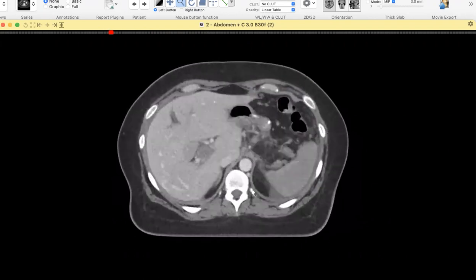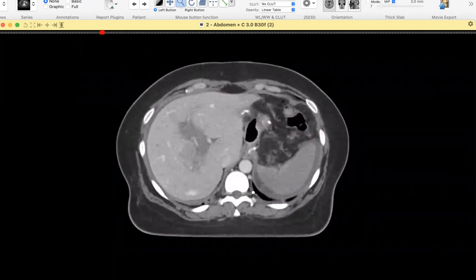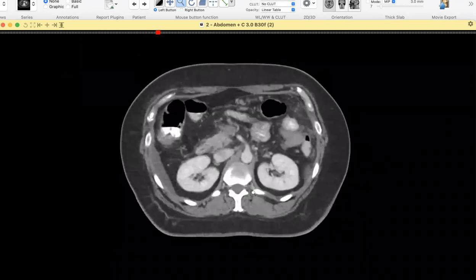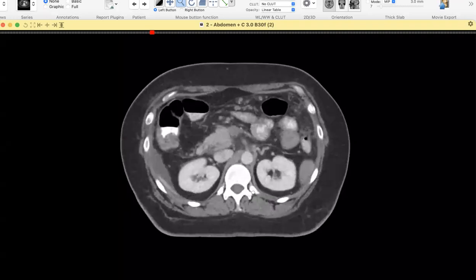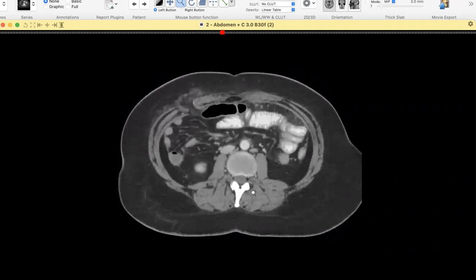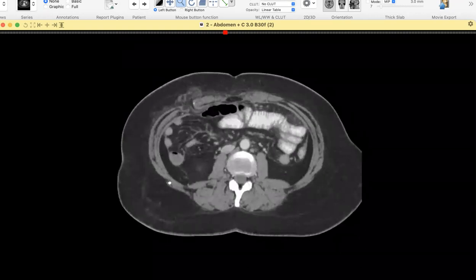There is, I think, a hernia noted within the right iliac fossa, but containing fat. Anything else? Portal vein is thrombosed here. There is portal vein thrombosis and superior mesenteric vein thrombosis. This would be another possibility of ischemic bowel disease. Right. This is a hernia. Okay, I think Spigelian hernia.